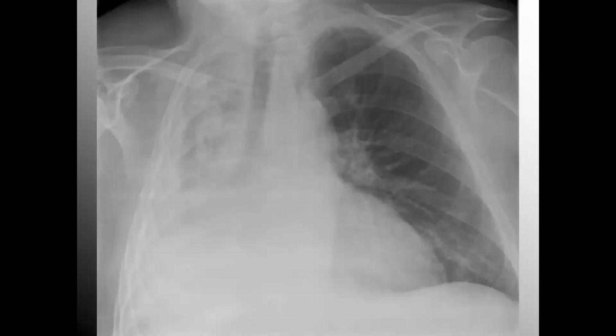Now, without getting too deep into how to fix the issue, some of you are already thinking about your bronchial hygiene, your hyperinflation therapies. Do they need mechanical ventilation? We'd certainly want to put the patient right side up, bad lung up, to try to force gas down the path of least resistance. But you've got significant volume loss of that right side. On occasion on the unaffected side, you will see compensatory hyperinflation, where gas, because it follows the path of least resistance, meets resistance, and all of the gas is redirected to what we would consider the good lung.